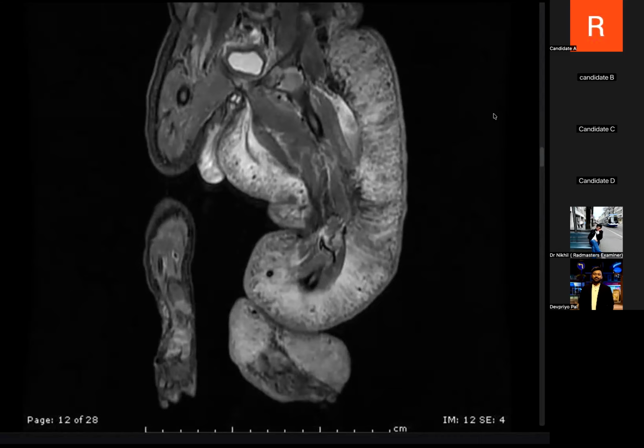If I were to tell you that this patient has low platelets and consumptive coagulopathy with this lesion, does it ring a bell about any possible diagnosis? Then it could be hemangioma, because hemangioma can cause a consumptive coagulopathy. Any specific diagnosis that you can think of? Not exactly hemangioma, this is not relevant to this case, but still it is something I wanted you to think about. If a patient has consumptive coagulopathy, do you know the name of the phenomenon associated with it?